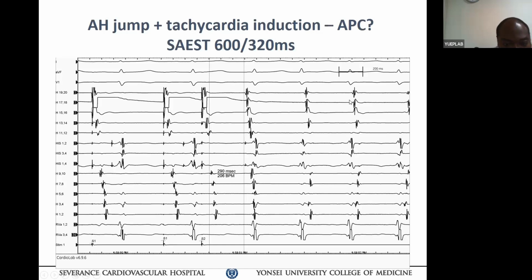Actually, CS34 should be late. CS34 is later, not early, because your wavefront is breaking up between CS5 and CS34, positive and negative. You see the second bit there during the tachycardia: CS34 is negative, CS56 is positive. The last bit is hiding the cutoff, so I think it is later.